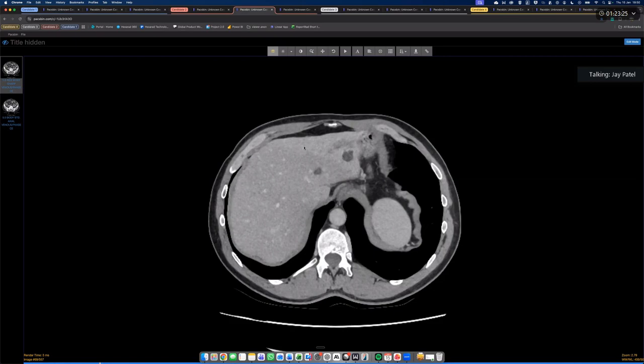The reason I have a caution with this is much like any description of anatomy by a radiologist, surgeons, if you work in a surgical center, will depend upon your description. So if you misclassify something as between a segment 8 and a 4A, that's a different type of surgical procedure they'll undertake.